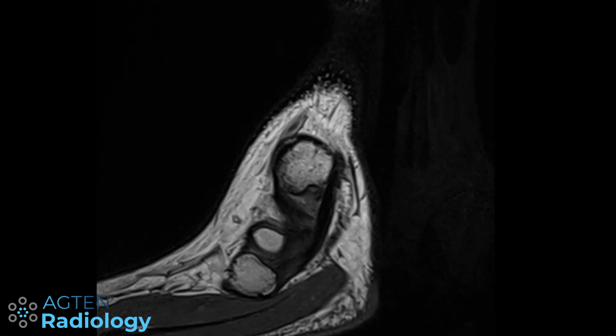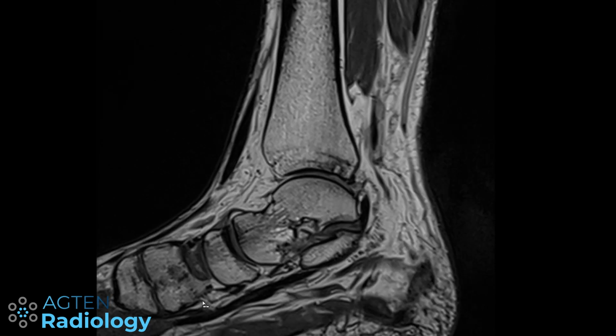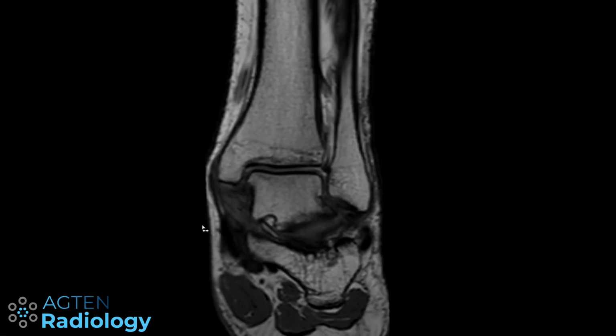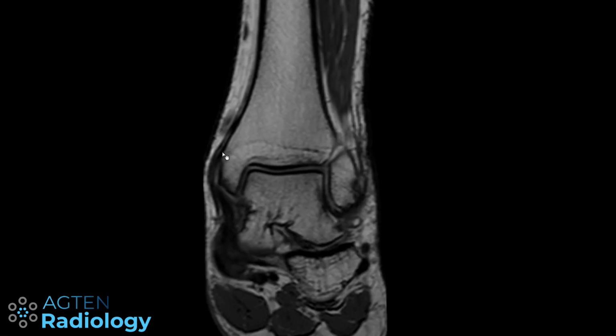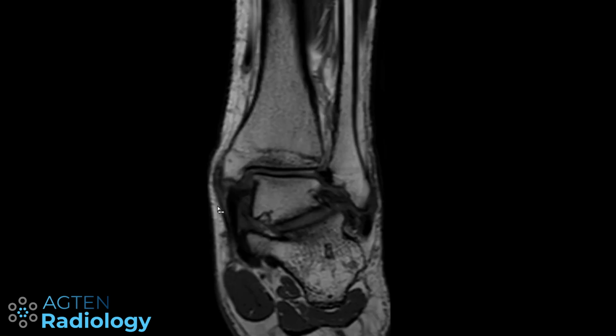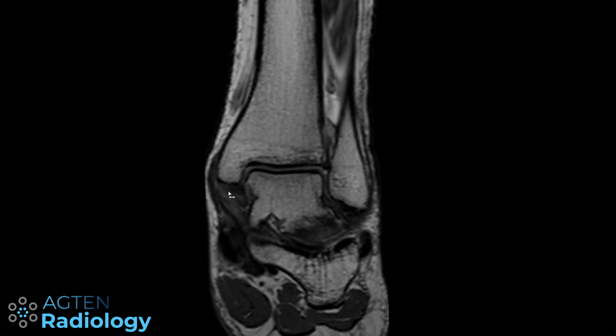So I have to really focus a little bit more on the anatomy and make maybe some assumptions. Now this is a patient with an ankle distortion a few months ago with persisting pain, but there is no indication in any of the reports where the pain actually was. He's got other problems too, as you can see here, this sleeve avulsion here, and then this very extensive scarring of the deep layer of the delta ligament.